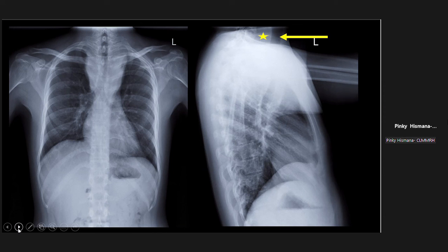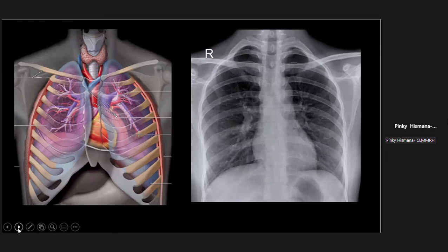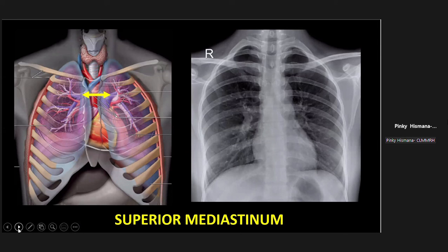Amo na siya actually take away message ko sa inyo nga when you have X-ray, very limited actually man ang ma-derive nyo nga data or information from the image. That's why radiologists who sees this image would suggest usually that a CT scan or MRI should be done to further clinch the diagnosis. So let's proceed now to your superior mediastinum.